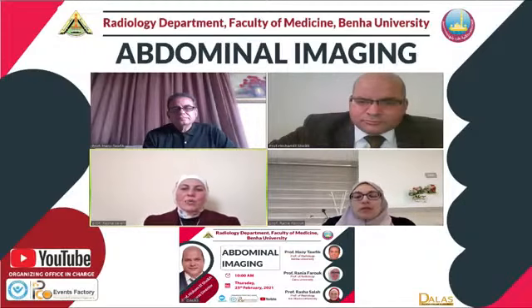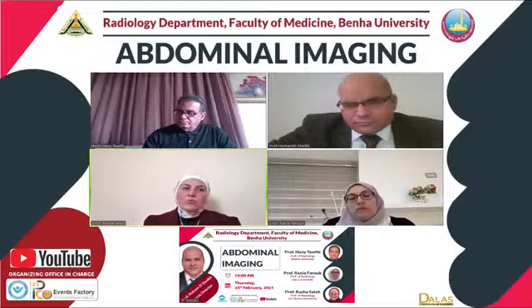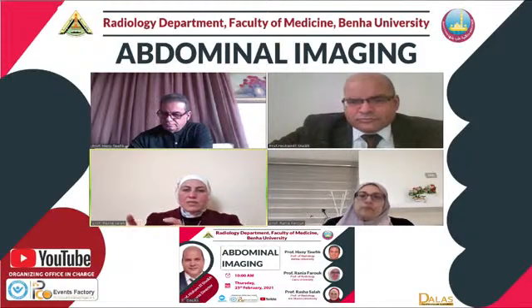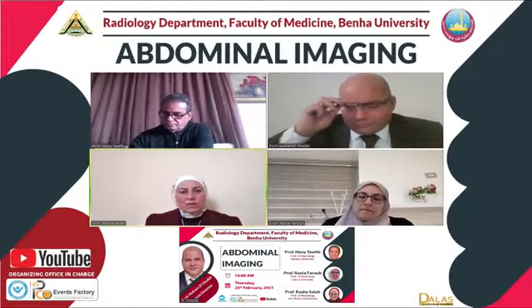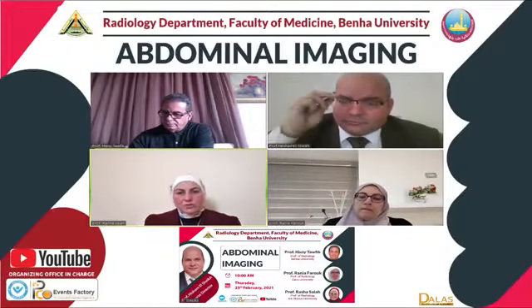الجل هو في الجايد لاينز دلوقتي، هو كان زمان بصراحه يعني في حالات انا كنت حطاها كنا حقنين جل، دي حالات قديمه شويه، دي كانت في الانيشيال. دلوقتي الجايد لاينز they don't recommend ان احنا نحقن جل علشان ده بيدي false impression للفايوليشن للcircumferential resection margin. فلو انا عندي، لان ده بيعمل ديستنشن للريكتم فبيقرب لي الريكتم من الريكتال وول من الميزوريكتال فاشيا، فممكن يديني لو التيومر طالع كتير بره الريكتم هيديني فولس بوزيتيف ان في فايوليشن للريسكشن مارجن.